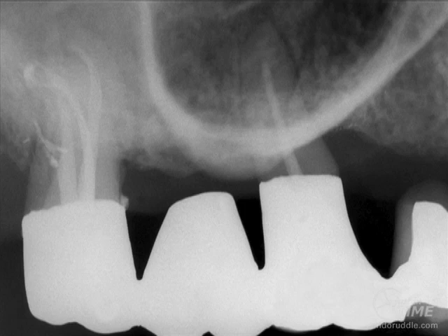root? The patient flared up a couple times. They've had to go on antibiotics. There's a thickened periodontal ligament space, but if you were to look at a CBCT scan, there's a frank lesion with sinus communication. One visit to remove the gutta percha and to get through the block, probably an hour and a half to get through the block and get to the apical portal of exit.